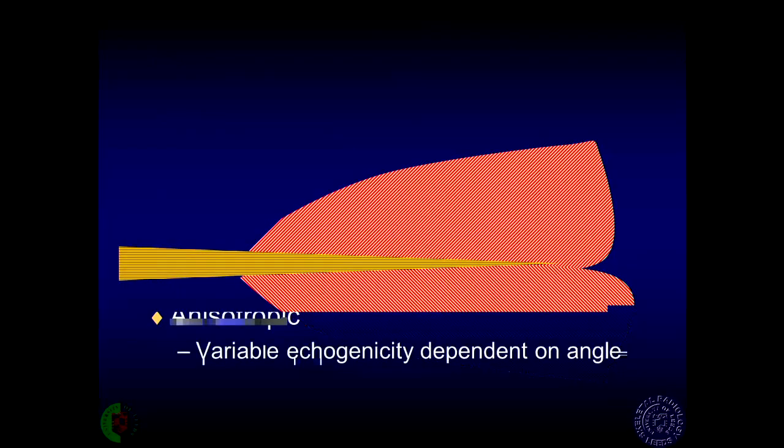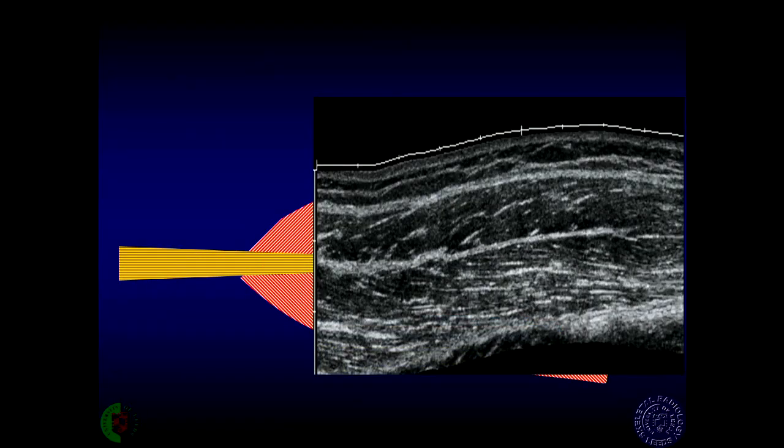So this is the typical appearance of a bipennate muscle. If I just overlay an ultrasound image there, you can see the typical appearance here. You can see the tendon coming in, and then the tendon stretches out and thins out in what some people term the myoaponeurosis. So this is an intramuscular portion of tendon that slowly peters out and finishes quite far down the thigh in this patient's rectus femoris. And from this feed off the muscle fibers.